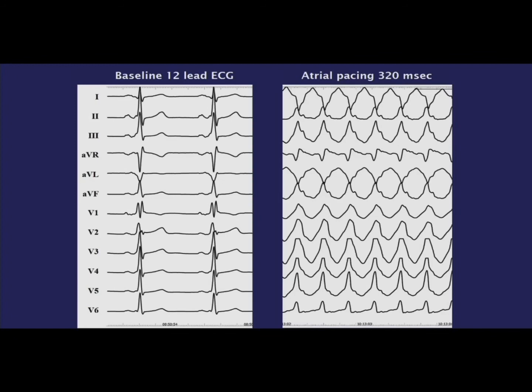It's a positive deflection, a positive QRS. So this is when you have to remember that our nomenclature for the chambers is not totally accurate. The right atrium is also the front atrium, and the left atrium is also the back atrium, and V1 sits on the front. So if you have a positive QRS, that means the vector is coming back to front, from the left atrium to the right atrium. And this is positive, so that suggests a left atrial or posterior atrial connection or origin. How do you distinguish between a left free wall and a posterior based on the EKG?